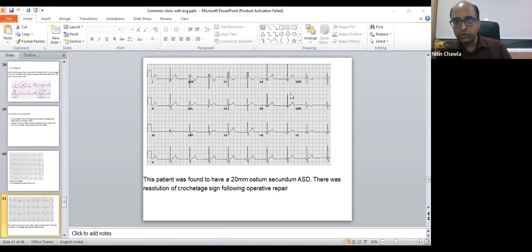If you see in this frame also, I will just remove this frame. Here also, there is a T wave which is at half of the R wave in lead V3. But when we go to long lead 2, we can see the R wave and we can see the T wave. We can see QT, which is nearly 40% of RR. So in one go, we can clearly say that hyperkalemia is not there. QT prolongation doesn't look like it. And two major problems we have already removed from the differential.